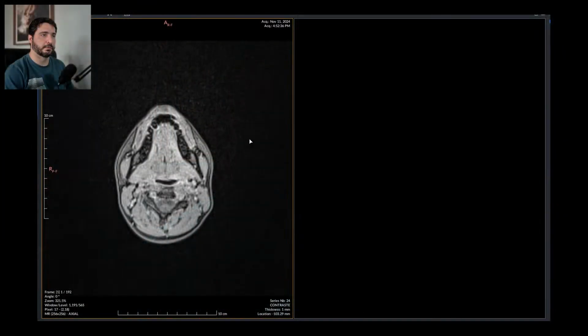If you are new here, my name is Galvani. I'm a diagnostic radiologist, and I read and report scans live so we can enjoy them together. I have downloaded already the first scan of this morning. It's 8:30 in Brazil right now, and I'm going to share my screen.